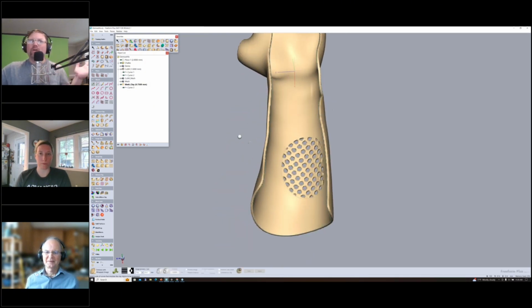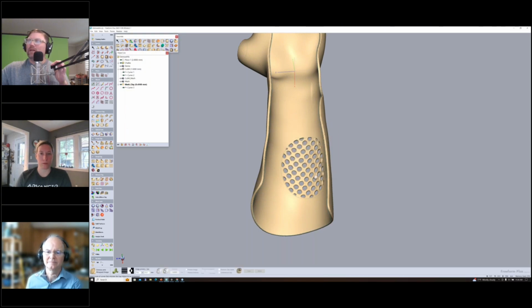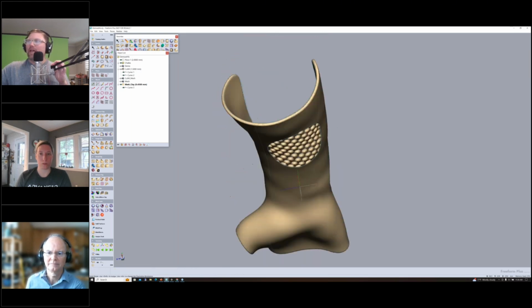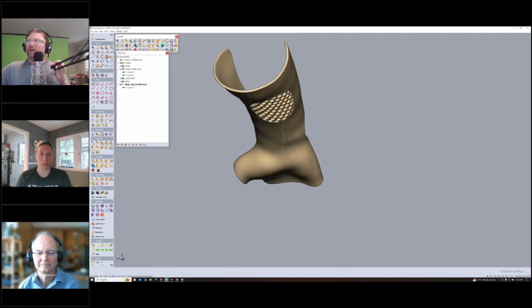However, I'm where I want to be, and this is one of the beauties of playing in the clay coarseness: I can say, hey, I just want to bump up the resolution of this just a little bit. And now I've smoothed everything out. Literally, I've doubled the resolution and smoothed everything out, including the edges here, and I'm ready to rock and roll.